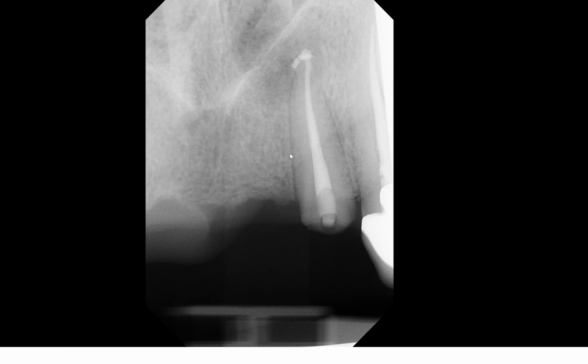Let's take a look at this again. Here we have nasal aperture, right? And here's the nasal septum. And just above the nasal aperture, there's this kind of amorphous radio-opacity. Again, it's really hard to make out the full length of the tooth, right? Because as this area looks like, there's a normal trabecular pattern. And also keep in mind that there's a sharp vertical angulation when you take a periapical radiograph in the anterior maxilla. Therefore, you're seeing bone patterns even though this is above the nasal aperture.